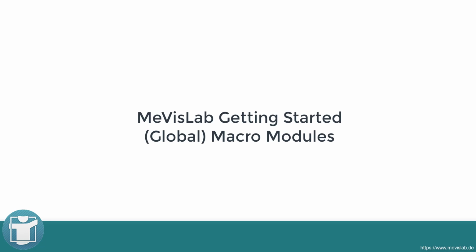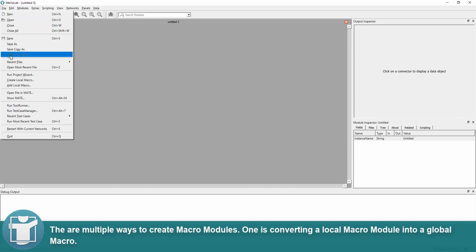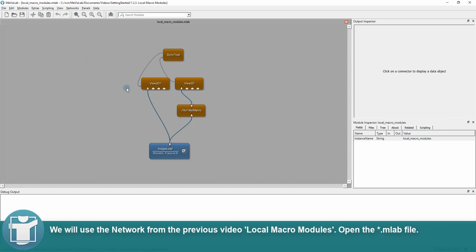In this video, you will learn how to create global macro modules and see the differences to a local macro. There are multiple ways to create macro modules. One is converting a local macro module into a global macro. We will use the network from the previous video local macro modules.